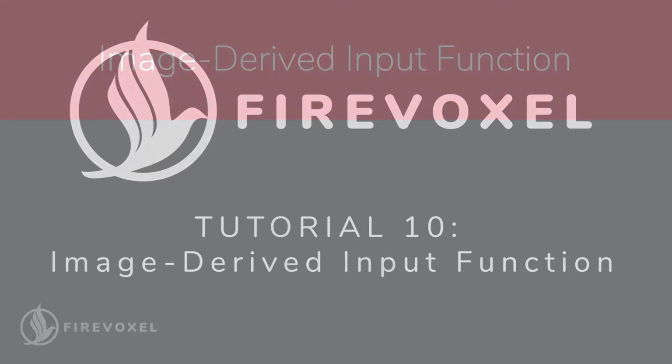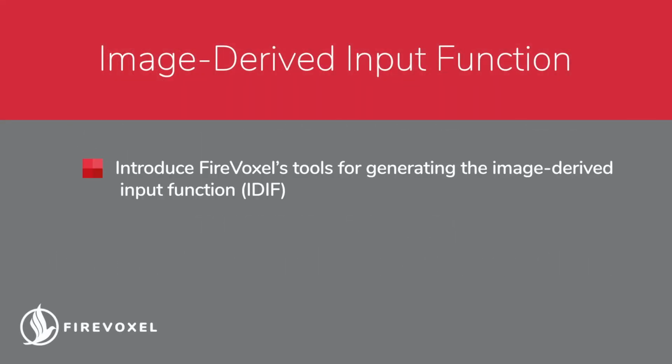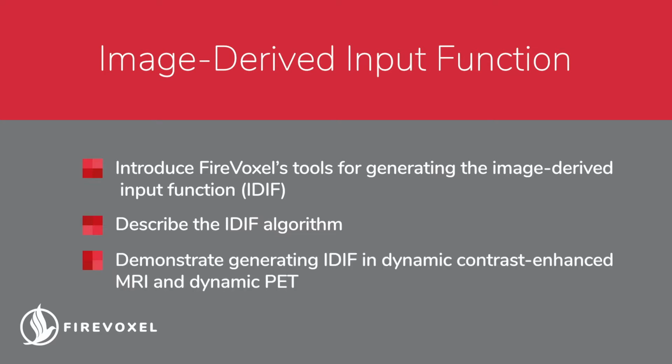In this tutorial, we will introduce FireVoxel's tool for generating the image-derived input function. We will describe the algorithm used in FireVoxel to derive the input function and demonstrate its application in Dynamic Contrast Enhanced MRI and Dynamic PET.